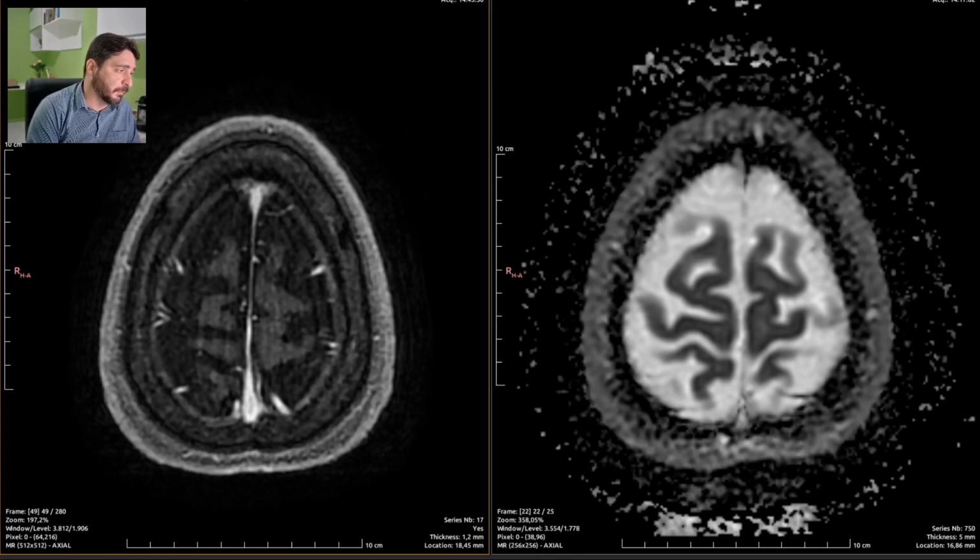Mild. We've got it. I'm also going to add that bit of hemosiderin deposits on the area of malacic gliosis.